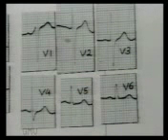Now come to chest leads and study the pattern of QRS complexes from V1 to V6. If the pattern is normal from deep S wave in V1 to tall R wave in V6, then measure SV1 and RV6 to rule out left ventricular hypertrophy. Here SV1 plus RV6 measures only 18 millimeters, which is less than 35 millimeters.